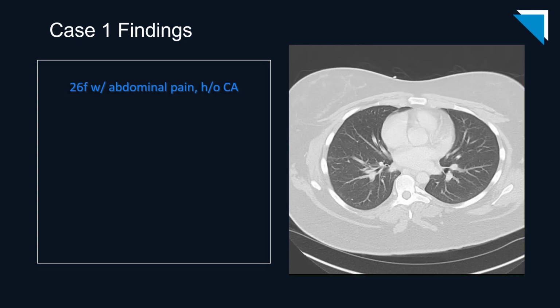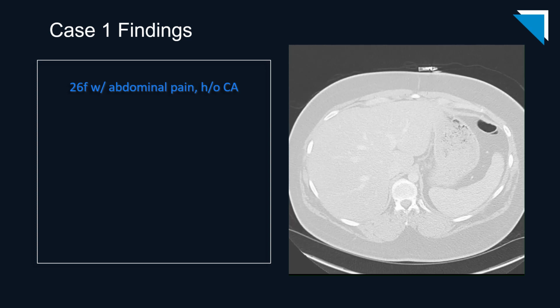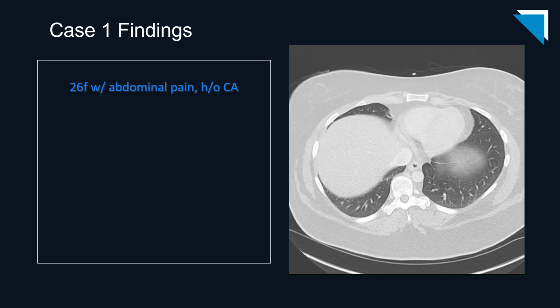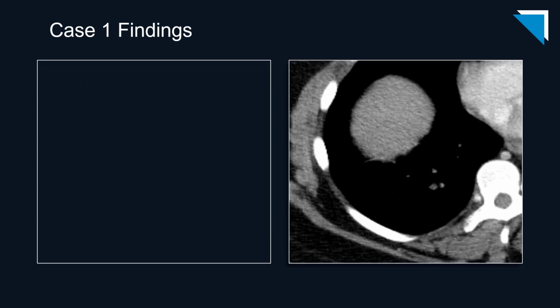In every body case, I will put the lung windows on to evaluate the lung bases for any pathology. You can also use this to scrutinize free air in the abdomen. Had I used my normal search pattern in this case, I would have gone through the solid abdominal viscera, the bowel, the vasculature, the pelvis, the abdominal wall, the osseous structures, and eventually the lung bases and lung windows. I would have missed a major finding in this case.